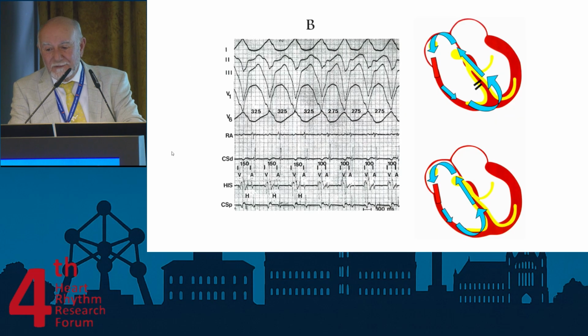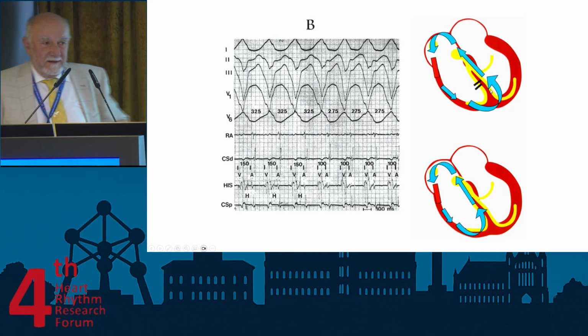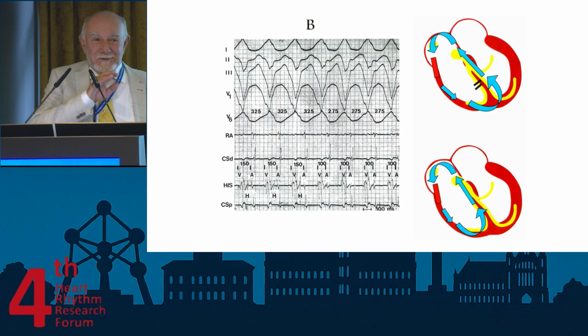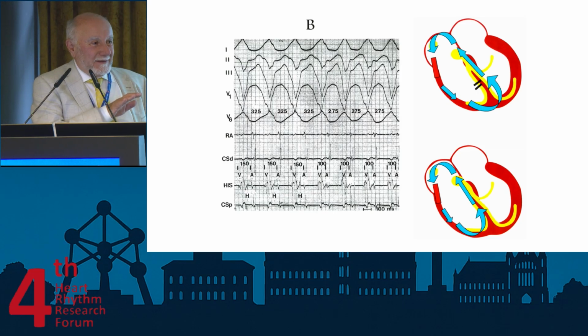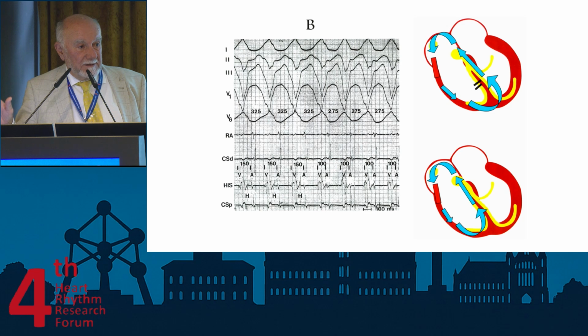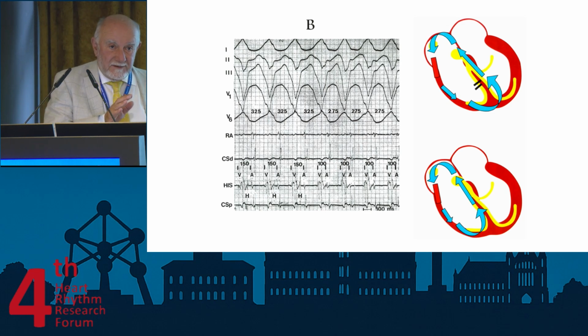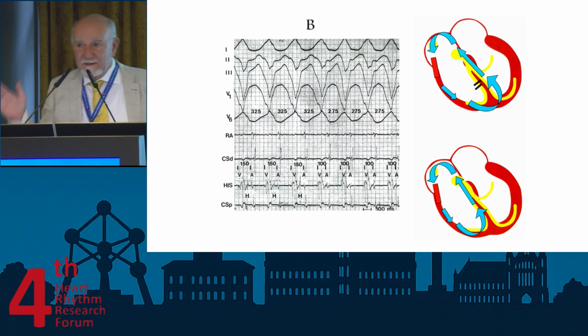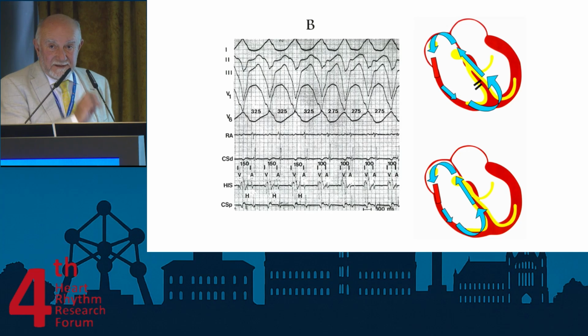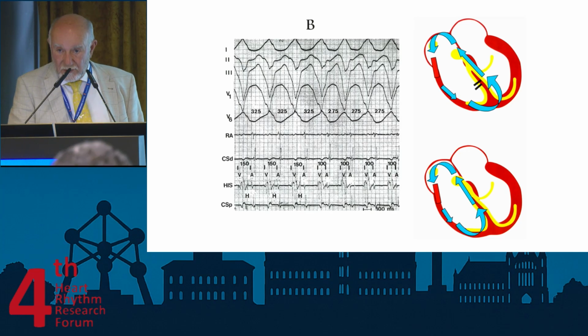Well, okay, that's a beautiful tracing. Look at this, what is happening here. We have seen with John Gallagher the acceleration of tachycardia when right bundle branch block disappears. This left-sided accessory pathway, left bundle branch block disappears, tachycardia accelerates. Right bundle branch block disappears, right-sided accessory pathway, tachycardia accelerates. We see here exactly the same phenomenon, but retrogradely.